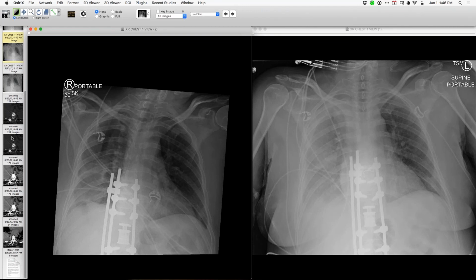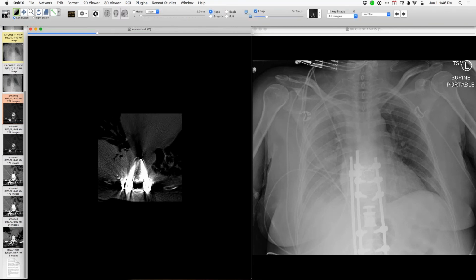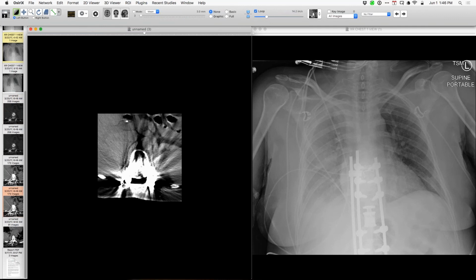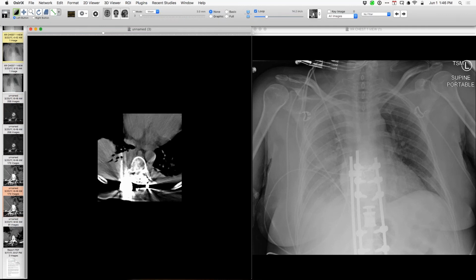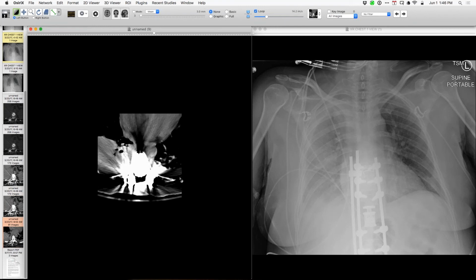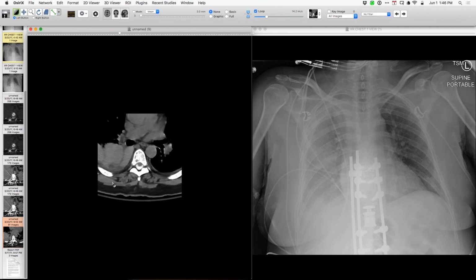So they did a number of imaging exams, and I have to try and pick out the one that shows the location of the leak and the contrast medium going into the pleural space. Just give me a moment to pick out the one that I think showed it fairly nicely. If we go up high here, at least at this part of the exam, you can see this is high attenuation. So that is contrast medium. And they described the leak, and then they put a chest tube in. They described the location of the leak as being fairly close to where the pleural drain is. So let's see if I can find that.